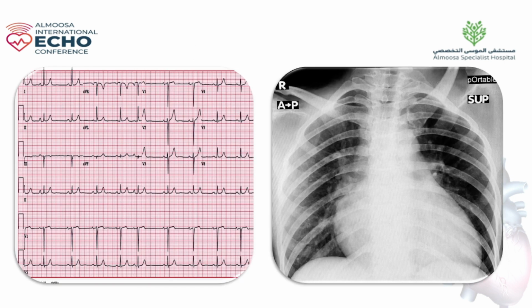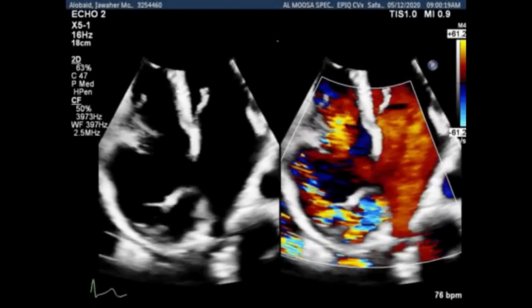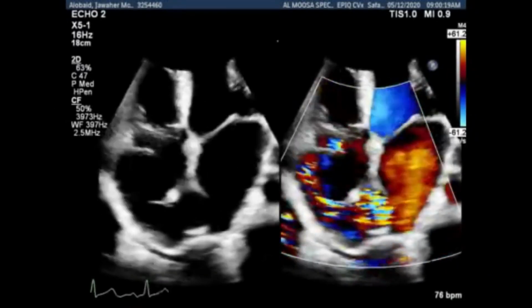Her ECG was unremarkable, just some premature atrial beats that could be for anything rather than a cardiac issue. But the chest X-ray shows atrial enlargement, especially the right atrium, and mild exaggerated bronchovascular markings. So this gave us one clue to do an echo for her to delineate any cardiac problem. And this is the echo.